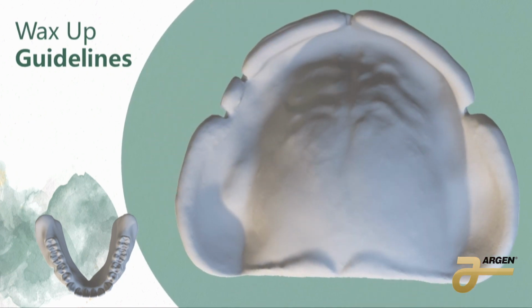And then here on the underside, we have our posterior palatal seal. So this is where you can come in the wax up stage. You can turn it over. I'm going to show you that in 3Shape. And you can smooth it, clean it. You can check the thickness. It's okay if in the beginning it's not as easy as carving with your tool digitally. It's not as easy to make it as precise, but this is where we can clean it up. I still say carve it in the model, clean it up in the wax up.